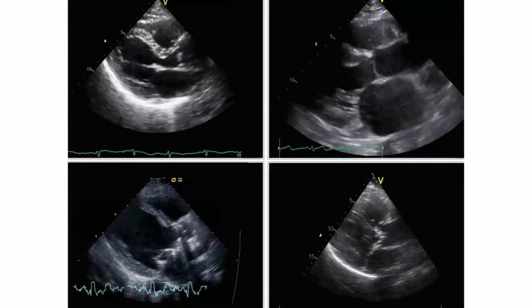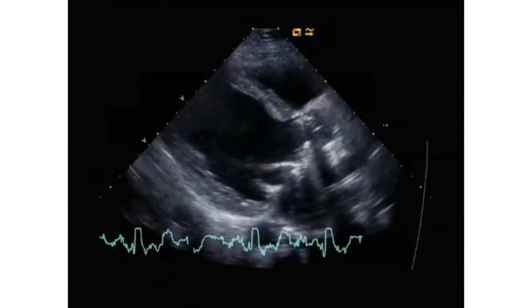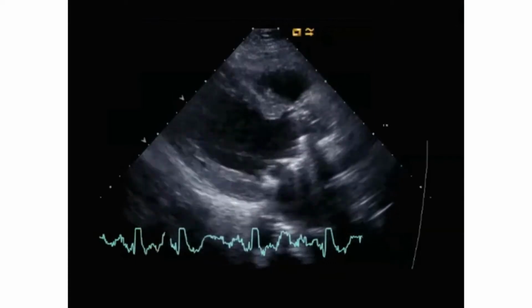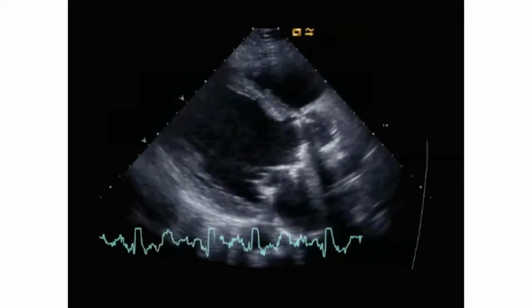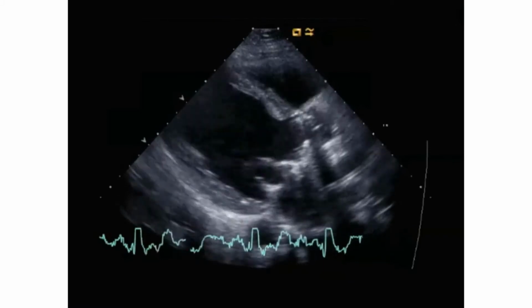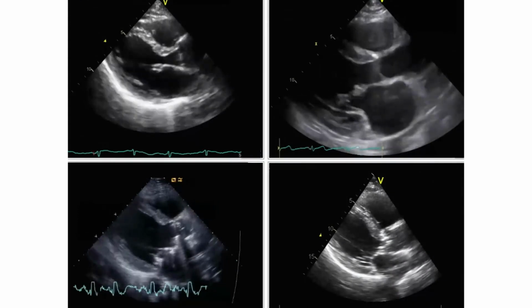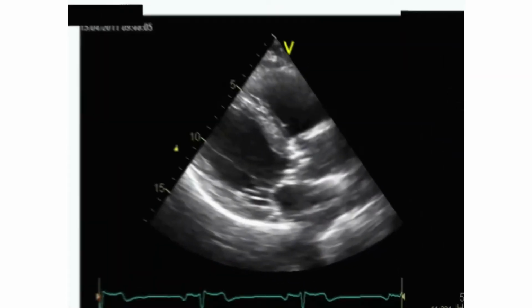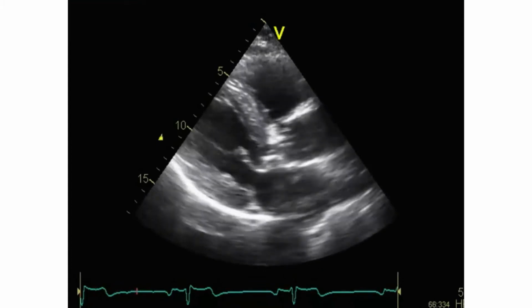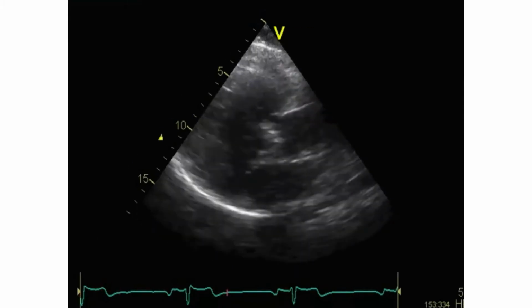This is quite awkward, but do you think this is the case with aortic stenosis? Look carefully, and at the end, I'll show you the last example with again another aortic valve. So, if you made your choice, we are ready to give you the answers.